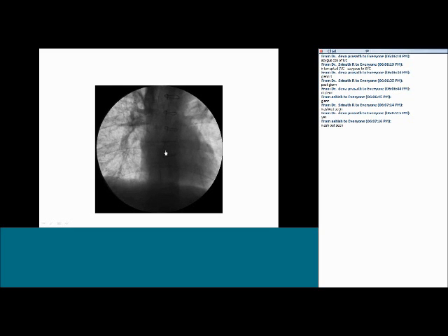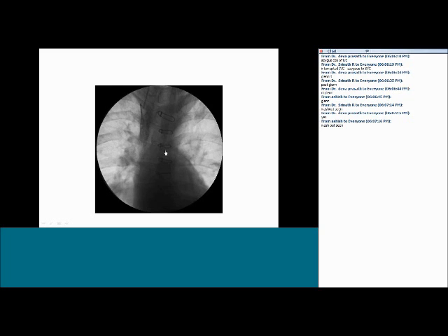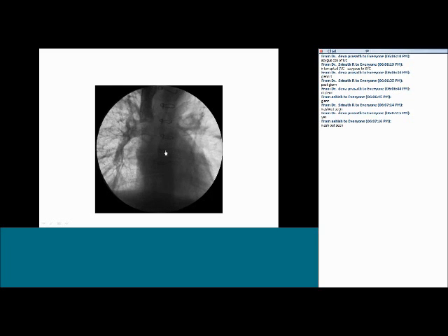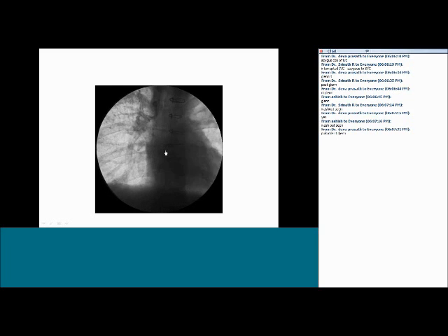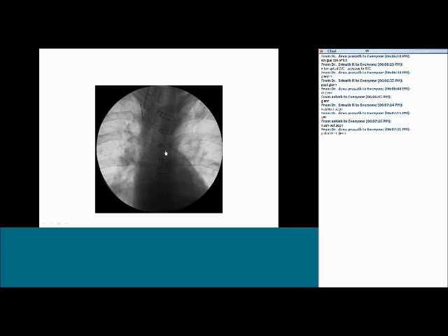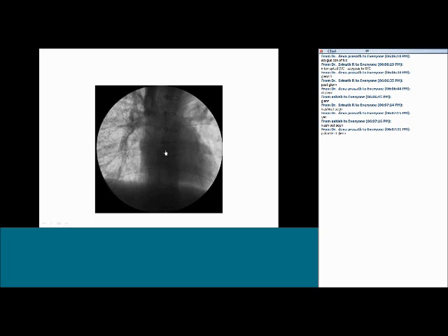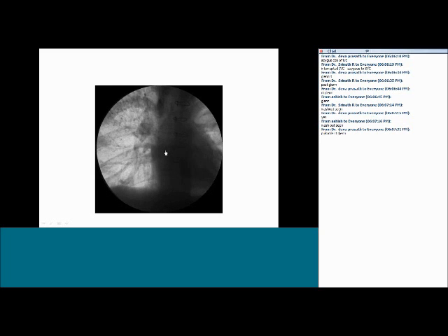So whenever you describe this angio, you have to describe the whole thing. It's the right superior vena cava injection, and it's a Glenn shunt, right superior vena cava connected to the right pulmonary artery with a forward flow through the pulmonary outflow. There is some forward flow because, exactly, this is a pulsatile right sided Glenn. That's the correct answer.